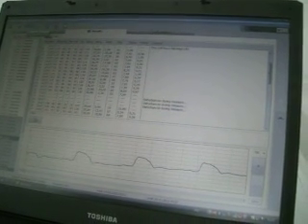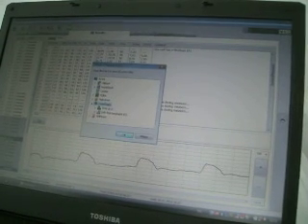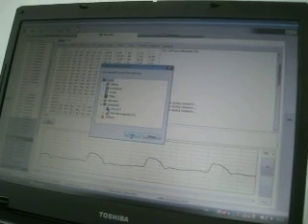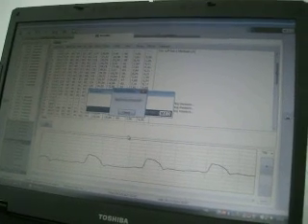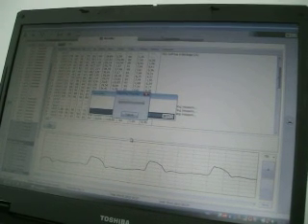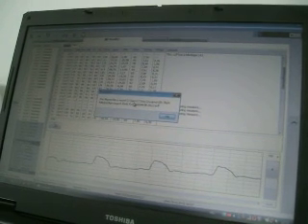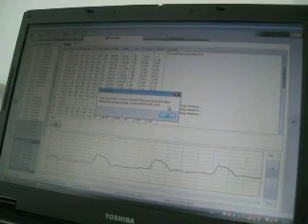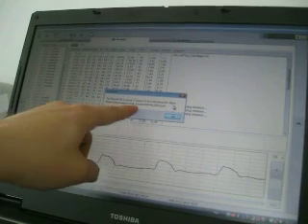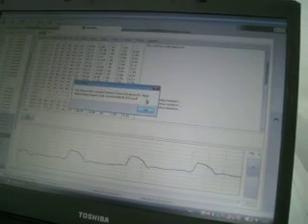This is how you can save a PDF report by one click. So if I click here, it will automatically generate a PDF. I will put it onto the desktop now. Ready, the report file is saved to the desktop with an automatic naming, which is first the name of the user, second the name of the patient, and after that the date of the PDF generation.